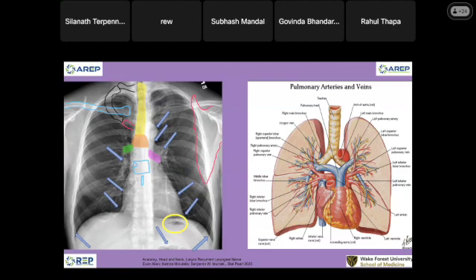The tip should be in the SVC or atriocaval junction, but sometimes it just goes in there somehow. And look at this. I know I'm talking about this question, but if you can explain it to me, it means that we also understand the anatomy. See that? The filling defect in here is because of flow artifact. It's not because of thrombus. This one is the superior vena cava, and this one is about to be the right atrium. Blocked by the azygous vein. This is transverse colon. Good. Jejunum is blocked by the next transverse colon.